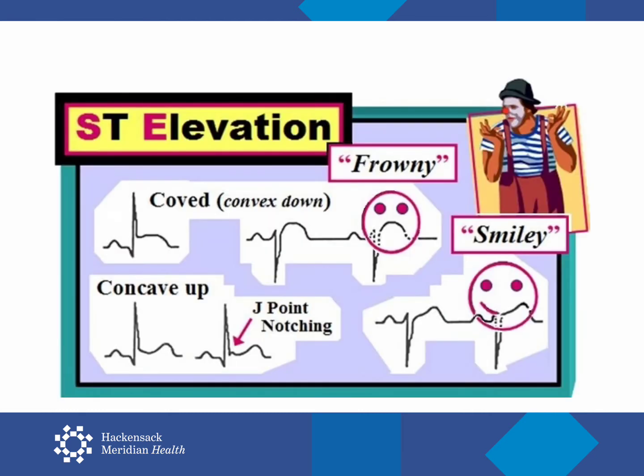Probably not. The configuration of some ST segment elevations suggests that they're not an MI. Some patients, for instance young men, can have a slight upward notch at the beginning of the ST segment, sometimes called a J-point elevation. This is not usually an infarction. One way to remember this is the notion of a clown smile. A frown with the edges down is more likely to be an MI. The smiley face, with the edges kind of notched in a concave up direction, that's more suggestive of benign J-point elevation.